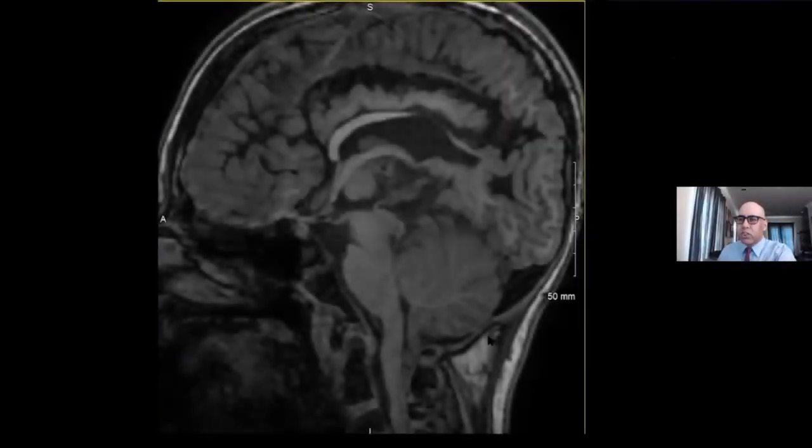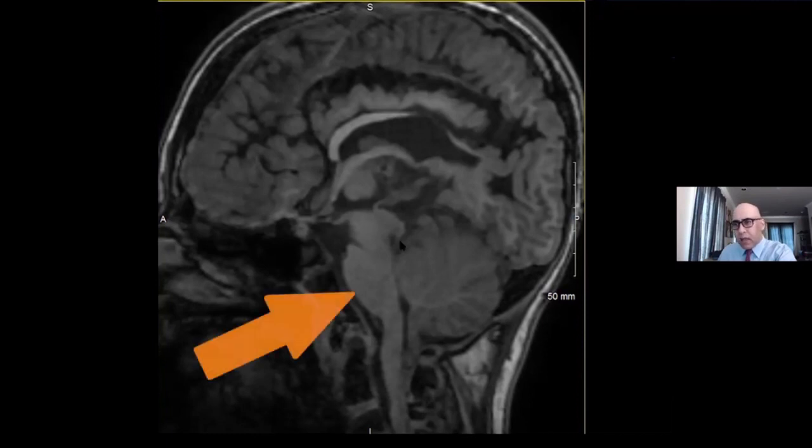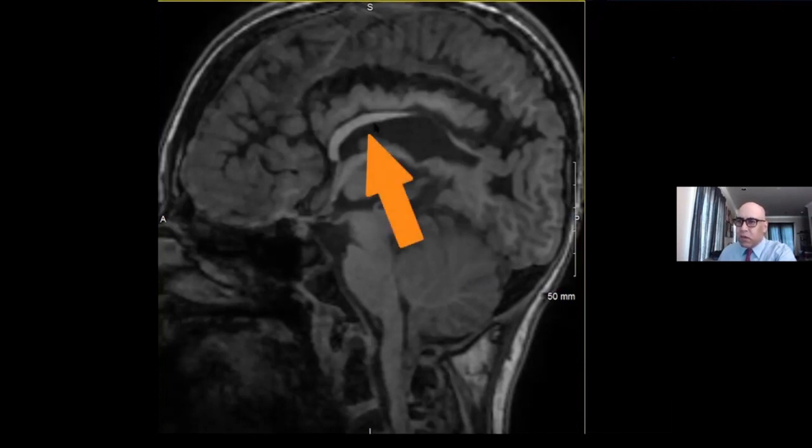This is an 11-year-old child with a history of myelomeningocele of the lumbosacral spine at birth that was repaired. So therefore, there's a known Chiari type 2 malformation. And we can see some of the posterior fossa abnormalities here that we'll go into in more detail. But while we're talking predominantly about posterior fossa malformations, we really need to also discuss the supratentorial abnormalities that go along with a Chiari type 2 malformation. We can see that there's posterior corpus callosal dysgenesis.